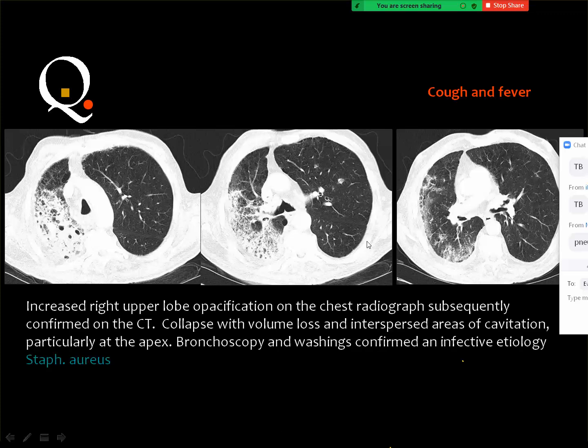I intended to provide this case because you know that all patients are extremely oriented by COVID. And many of the cases diagnosed as COVID are not actually COVID. They are pneumonic consolidations due to any other organism.